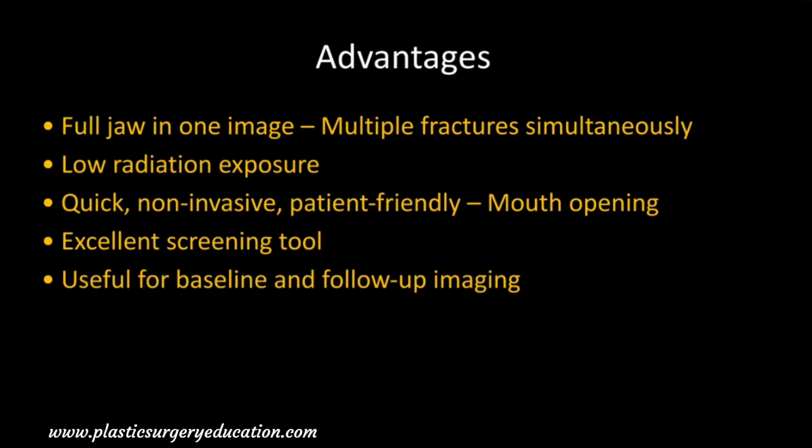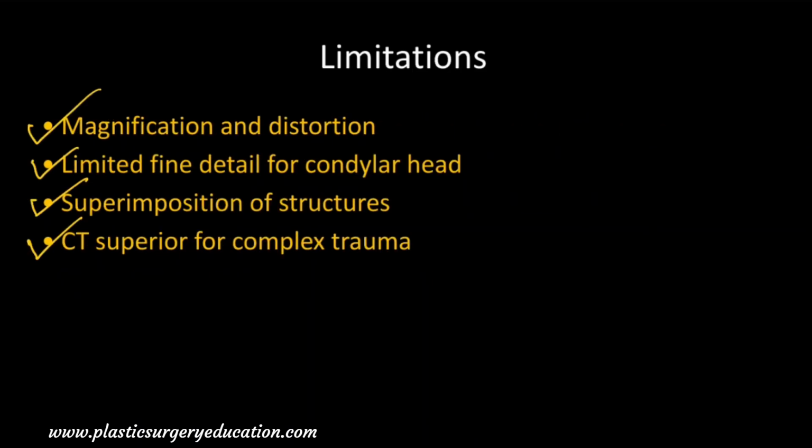So these days we commonly see only the CT scans and more so the 3D CTs. We rarely ever see the orthopantomograms, but nevertheless it has got its own set of advantages. We will encounter OPGs in clinical practice. So now we will see and read one OPG. We will try and identify the different structures in the OPG.